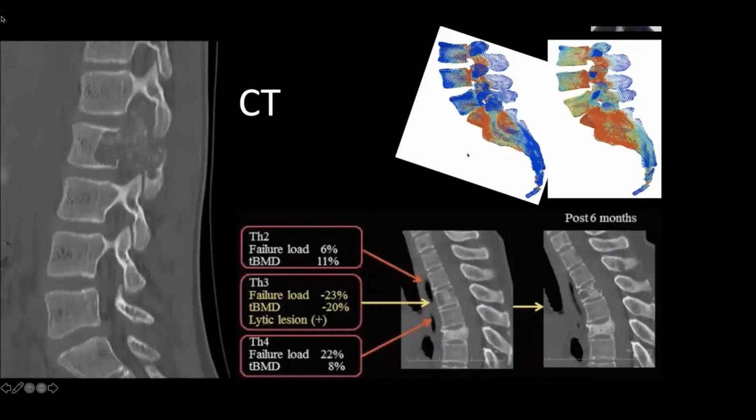What I wanted to show you here is that we can also take the data from the CT and actually use it for some very useful applications. We can do what's known as finite element modeling, which you guys may be aware of, which allows us to, for example, compare population data with an individual's data and look at things like stress-strain relationships across end plates.